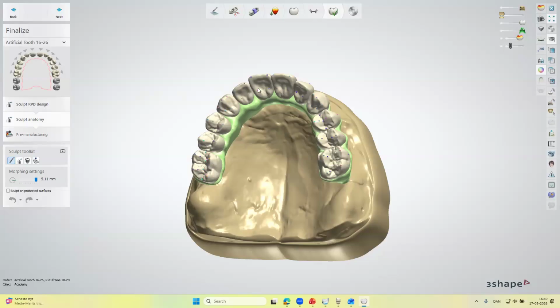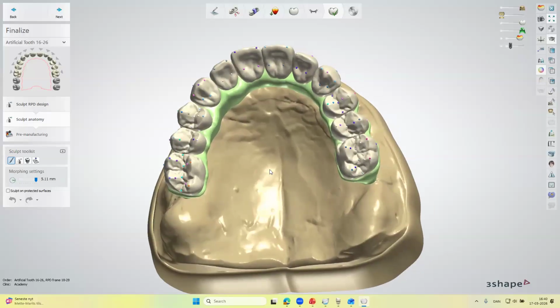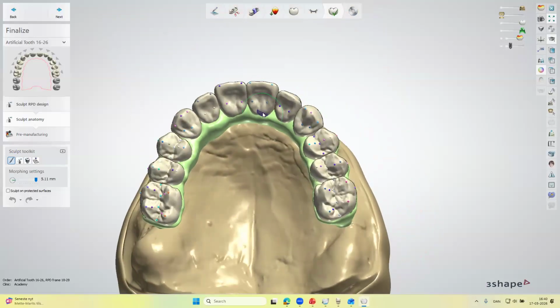And there's one more thing that it's worth mentioning. In here, I didn't load the additional file with the implant positions. So if you would have an idea of, let's say, creating the secondary structure with the screw holes, of course, we would have to have this information through. I'll show you where to find the file that could be loaded as additional files.